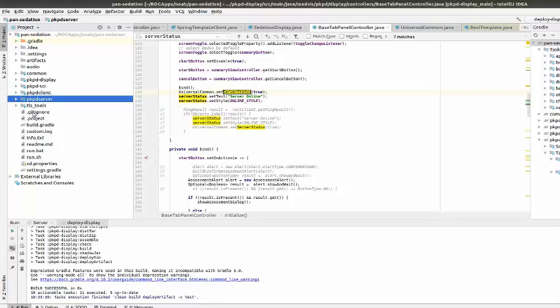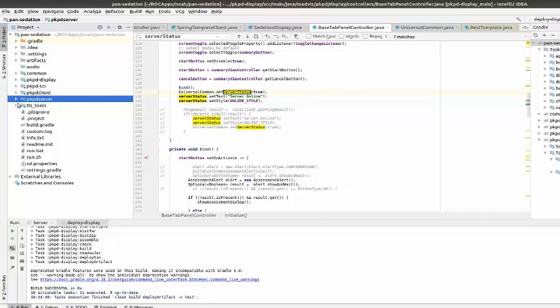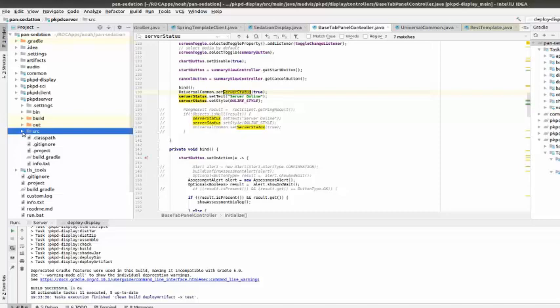Because it's in a medical setting, patient information security is really serious. So we've got our own self-signed certificate set up. This code just sets up the certificates that are used for the WebSockets, secure WebSockets and secure HTTP. It's just basic code for setting up self-signed certificates. Now the Spring Boot server is just using the standard Spring Boot technology.